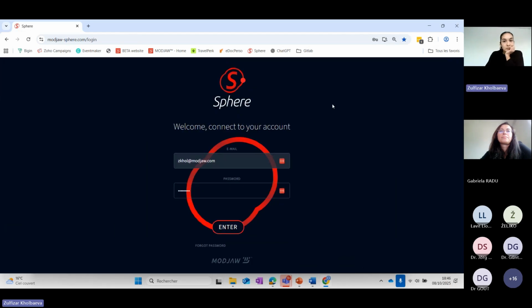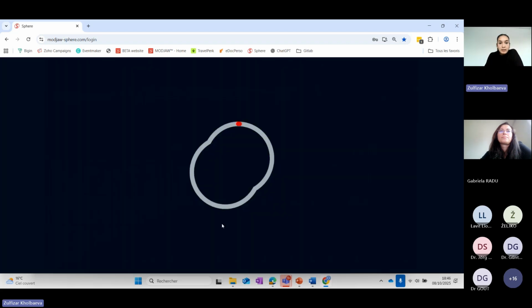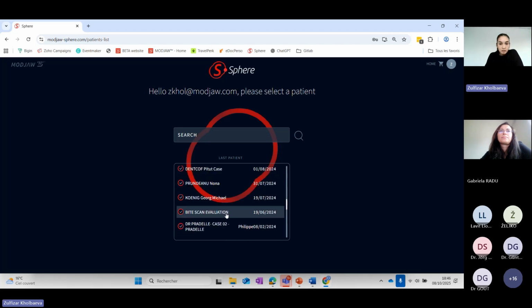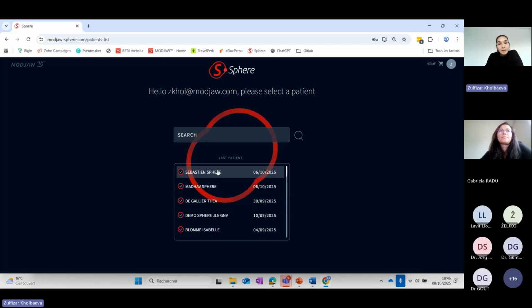So here I'm online. This is my account, my TWIM account, so I can enter. And I have access to all of my cases that I registered as a clinician. If you are a lab and you connect for the first time in Sphere, because you didn't register any patients, you will have 0.